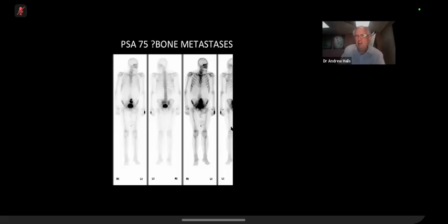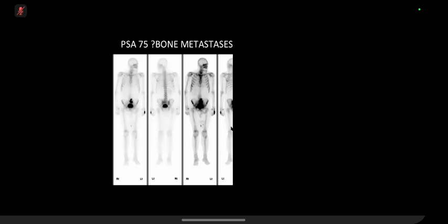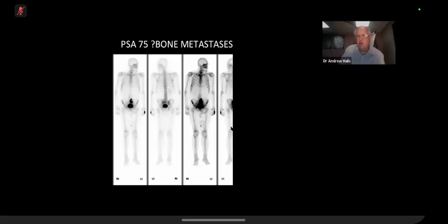Okay, so it's not on this particular occasion a super scan. I'll go on because I think you've done very well. Sorry, we did have some more views. You might not get any further with that.